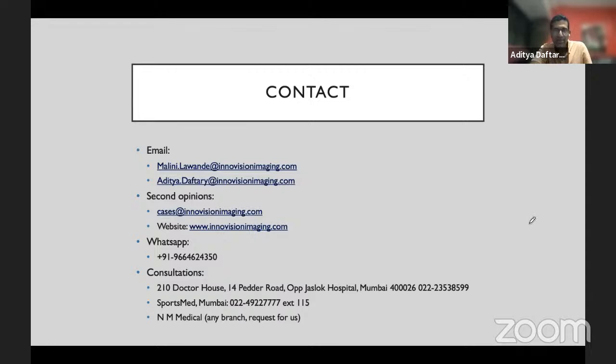The double PCL and double ACL signs on MRI are things we'll discuss more with meniscal structures. As for which sequence shows the anteromedial and posterolateral bundles best, I think I showed that to you on the axial MRI images. Non-fat suppressed axial MRI images are probably the best place to see the AM and PL bundles.